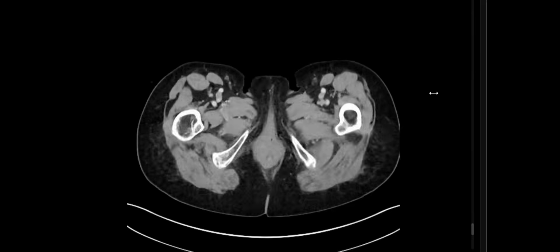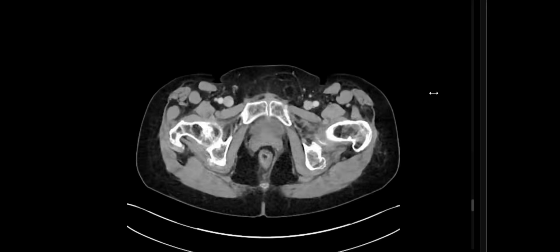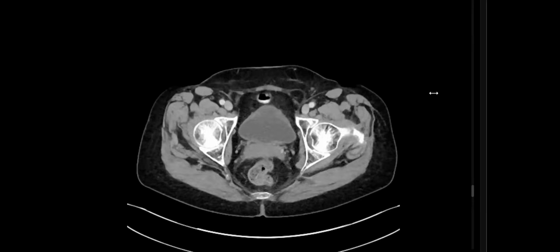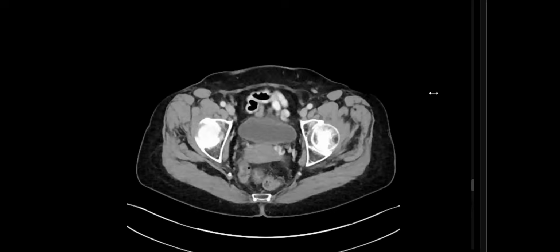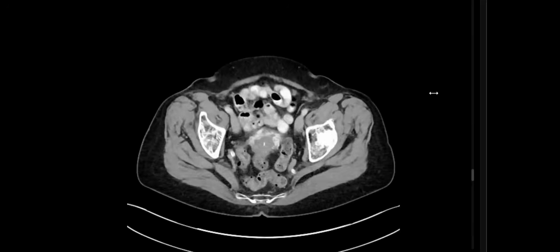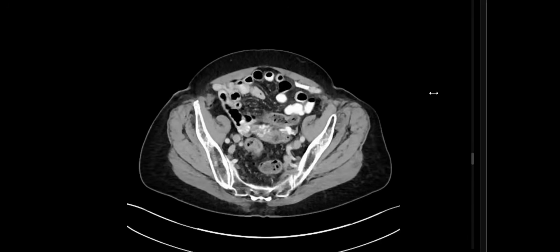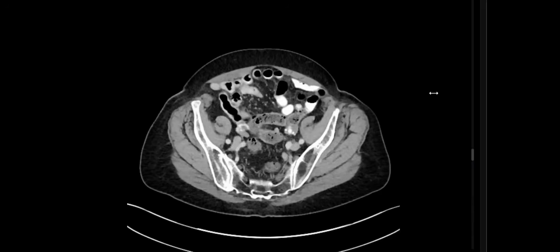Good, my friend. Just show us the abnormality again. I'll go to the area where there is also some bleeding, okay? This is an important case, my friends, and commonly missed in practice.